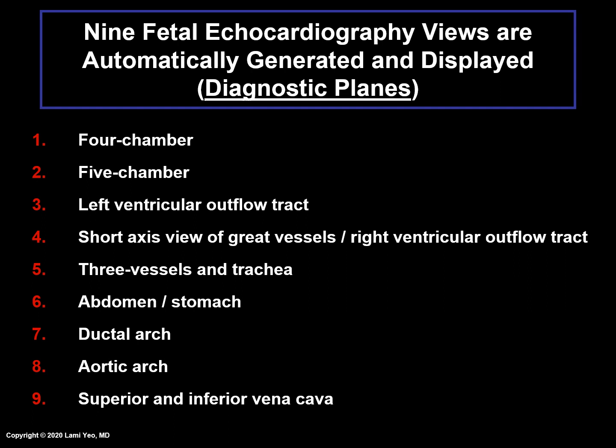We refer to the 9 fetal echocardiography views automatically generated and displayed by Fine as diagnostic planes, which were just shown and are listed here. Now let's review the normal anatomic characteristic features of each of these views.